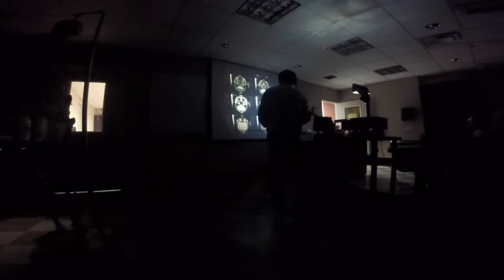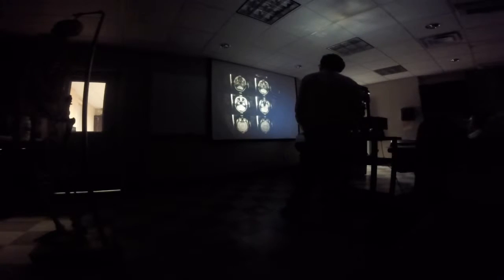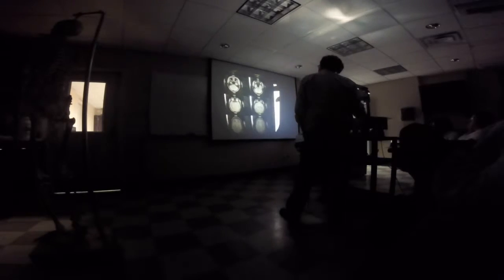What you'll notice is the cerebellum has a classic architecture. These are called folia. If you just look at the architecture of the tissue, it looks different from the hemispheres, a little bit.